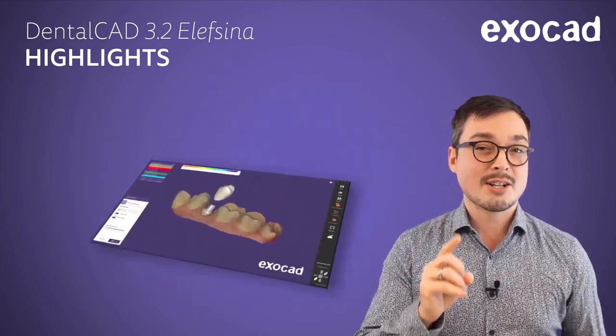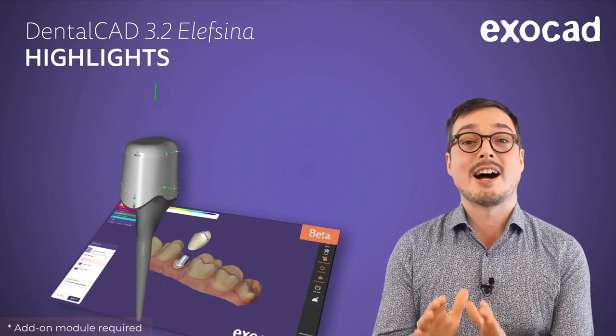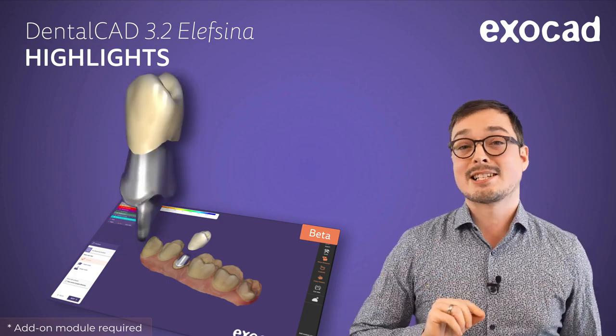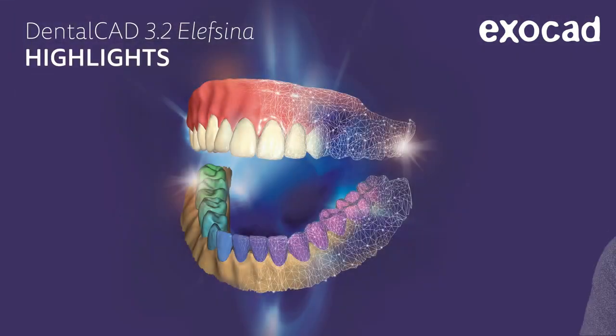Plus, post and core restorations can be designed and provided with a matching crown designed in the same step. And there is so much more. Let's explore the new features together in the next few minutes.